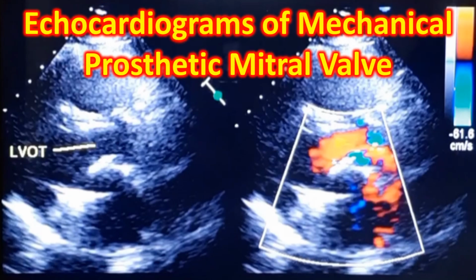Evaluation of a mechanical prosthetic valve is one of the most challenging aspects of echocardiography because of the dense shadowing caused by the prosthetic metallic material of the valve, so that you may not be able to pick up small vegetations and even thrombi which is situated behind the prosthetic valve. So we will see a few images from metallic prosthetic mitral valve.